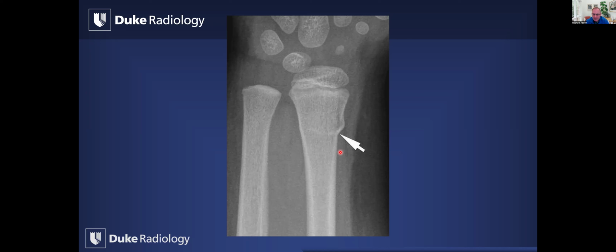That's called remodeling. In these low impact fractures, like buckle fractures, we may not see those healing changes in that regimented fashion. Instead, we may see just a touch of periosteal elevation and potentially some intramedullary bony sclerosis. So not much impact, not much injury to the periosteum, and therefore more subtle healing changes that look different.